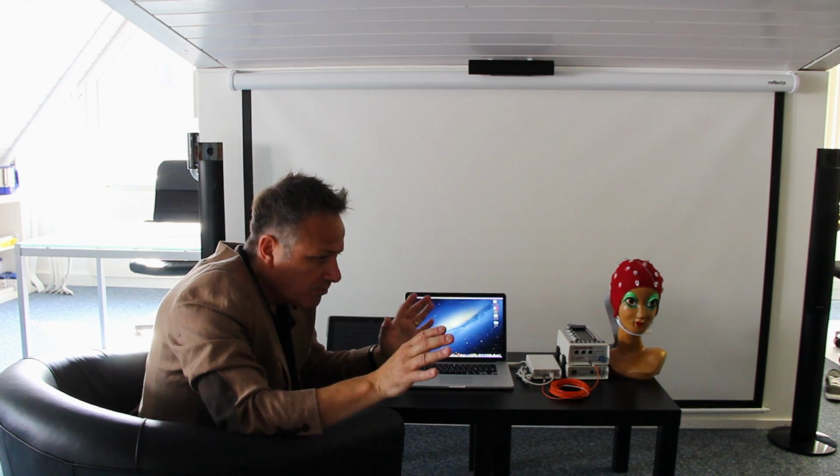The whole functionality is there. We can use the iPad to run a complete EEG. We can save the EEG, we can do anything on the iPad, which is absolutely phenomenal. We don't believe that any other supplier can do this on the planet, which is really neat. The app, we've discussed this before using an iPhone in that particular example, doesn't cost the world. We need Parallels, that's all we need, and then we can actually mirror the desktop on an iMac or on a MacBook Pro on the iPad.